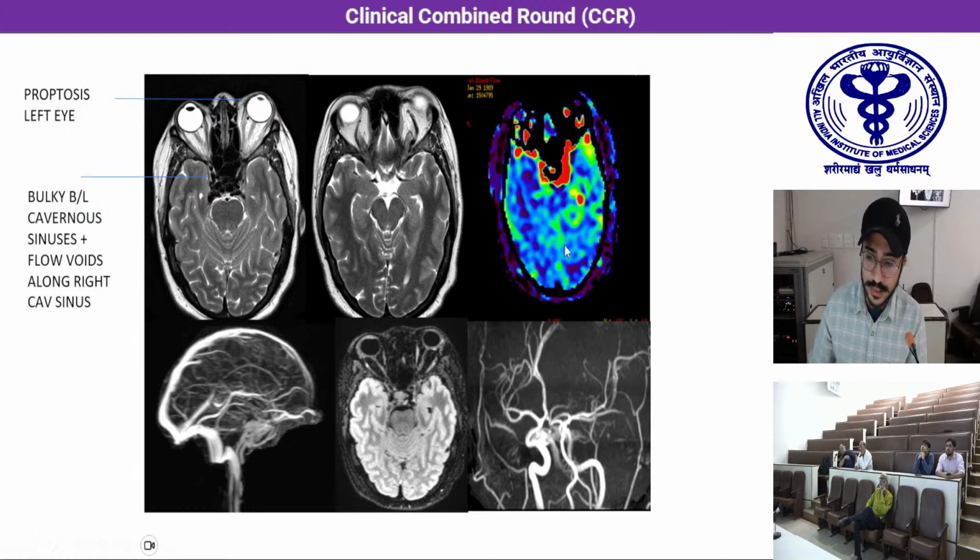So we performed ASL imaging as well. You can see that there is arterialized flow in both cavernous sinuses and in the left SOV as well. MRV was followed by this; we didn't see any evidence of CVT. On axial FLAIR images, the retroorbital fat and optic nerves were normal, which essentially ruled out retroorbital cellulitis.